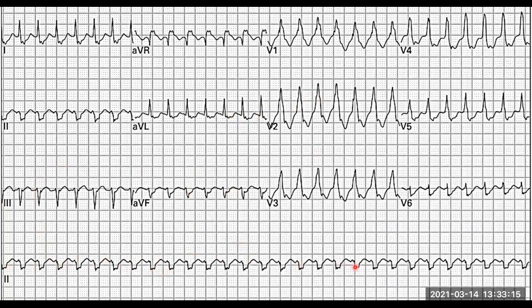There may be some hiding in here, which we'll get to just now. But the most important thing is that we can't actually see any atrial input. We can only see ventricular input everywhere. And if you look at the groupings, they are relatively regular. They do vary ever so slightly, but it's a minimal variation.